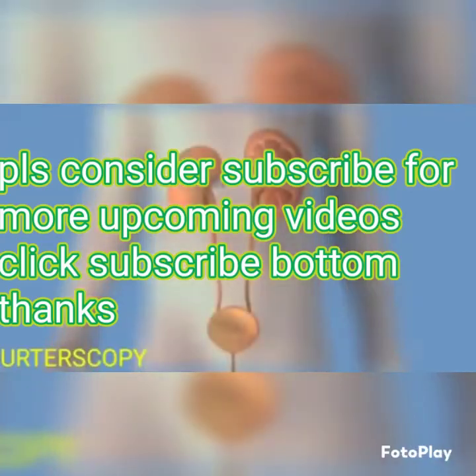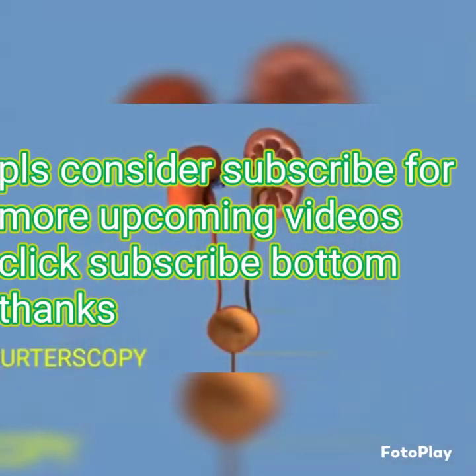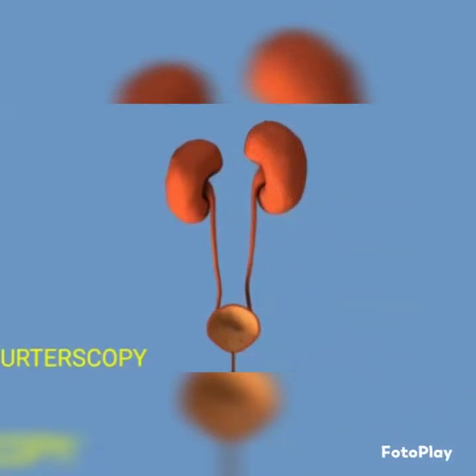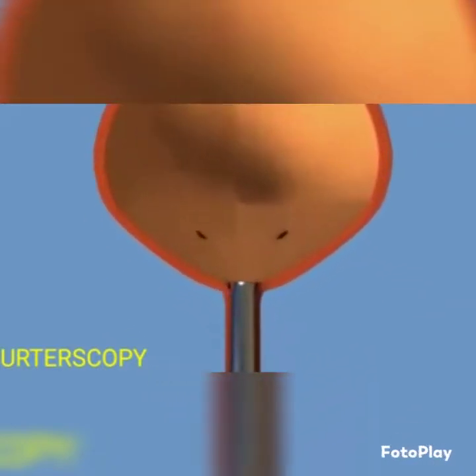With a tiny fibre optic camera is inserted through the urethra and bladder into the ureter or kidney. Ureteroscopy is used to remove kidney or ureteric stones and enables a direct view of the ureter and kidney to confirm or rule out other abnormalities. This animation shows the removal of a kidney stone. Ureteroscopy is typically performed with the patient under general anaesthesia.